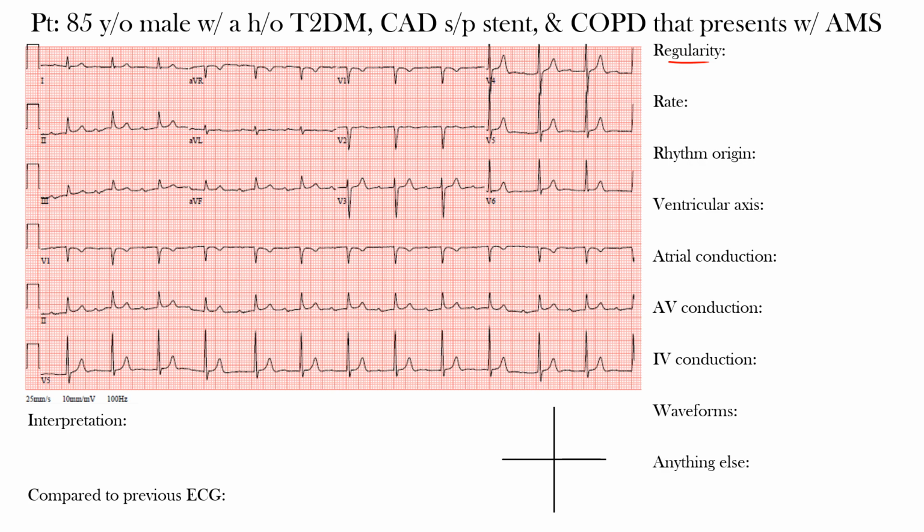Well, on first impression of the EKG, you probably notice that this rhythm appears to be quite regular. In fact, this is what we call a regular rhythm. So regularity, this would be considered a regular rhythm. And remember, one of the easiest ways to do it, and you can look at any interval, but the easiest one is we can look at this rhythm strip of V5 down here, and look at the R wave to R wave.